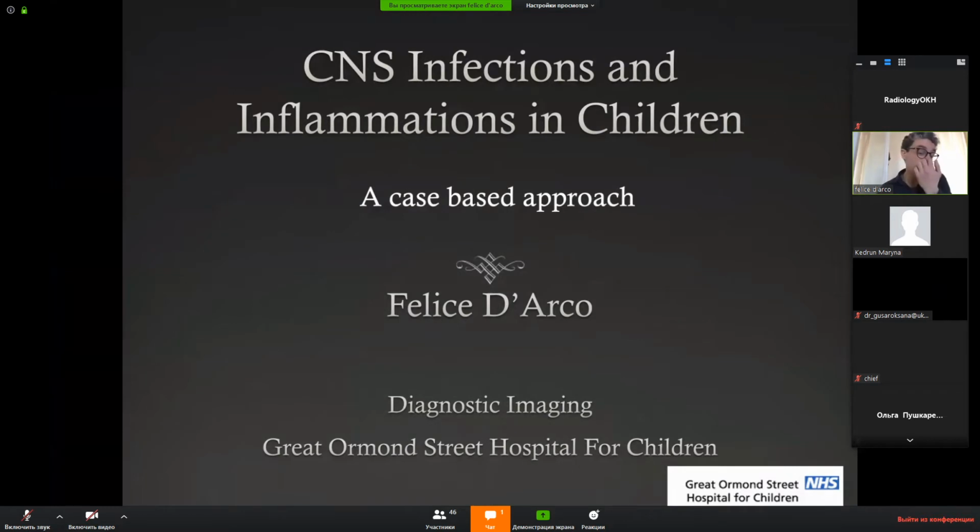So that's a very basic presentation on some central nervous system infections and inflammation in children. And I will show you, as always, some case-based presentation based on the mistakes I make every day, cases we see and discuss. Basically, what I would like to do is to show you some pattern recognition about infection.